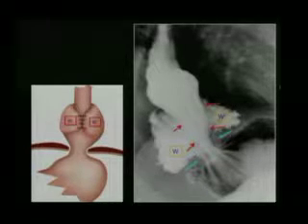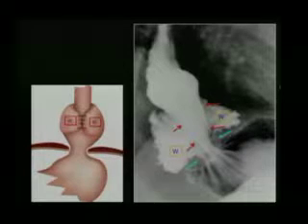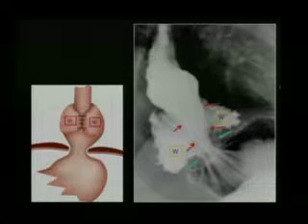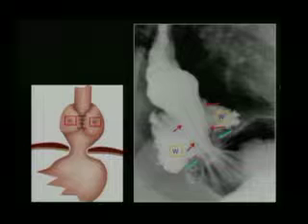In some cases, the surgeons do this on purpose. That's the reason I tell you that it doesn't have to be a complication 100% of the time. Sometimes this is on purpose. But this is the distal esophagus that is narrowed because the wrap is still intact.